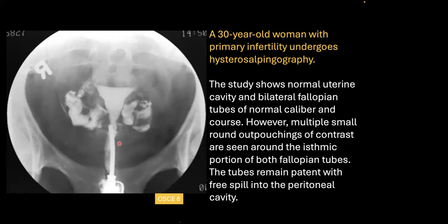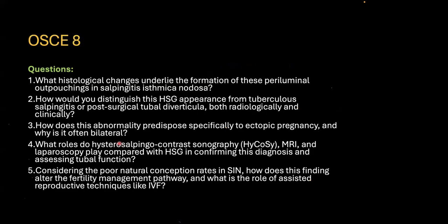These were all in the spotters, and now we are elaborating it in the form of OSCEs. Should I show the questions? Tubes are patent with free spillage into the peritoneal cavity? These are the questions.